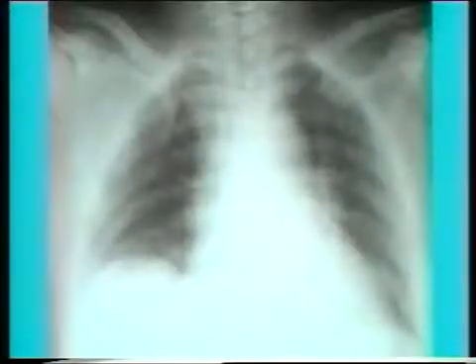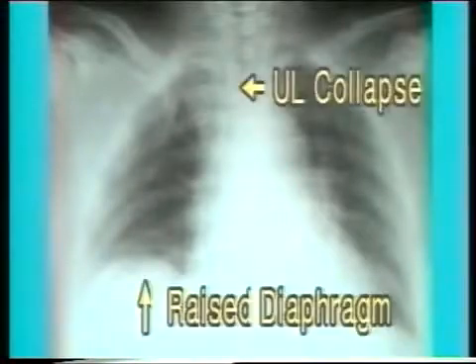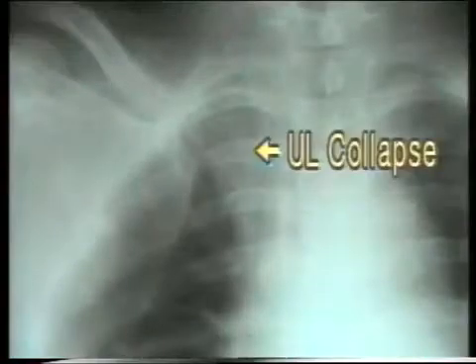This patient developed sudden breathlessness and severe hypotension on the second post-operative day following cholecystectomy. Note the collapse consolidation of the right upper lobe suggesting pulmonary embolism. The differential diagnosis will be aspiration or mucus plug obstructing the upper lobe bronchus, which was ruled out on bronchoscopy.